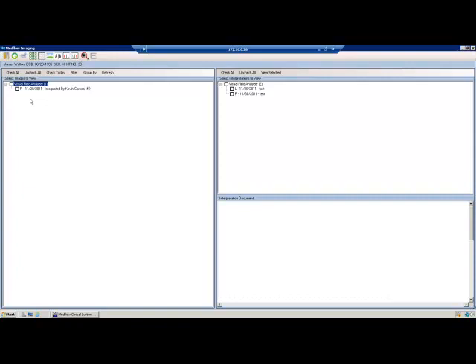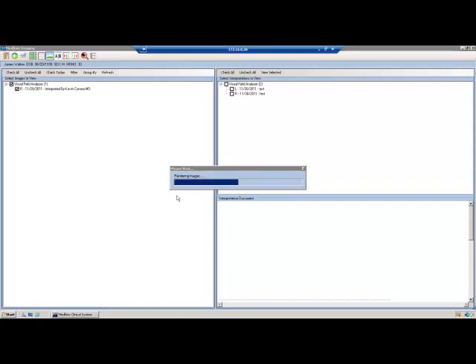To view the clinical image, you will select the image on the left-hand side of the screen. If you choose the bar up at the top to see a full screen of the page, it will pull the image that you selected. You will notice the toolbar at the very top of the screen to make any changes to the image that you're viewing. The door will exit the image and take you back to the screen that you were just on.